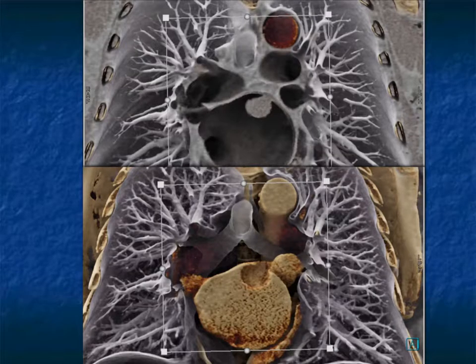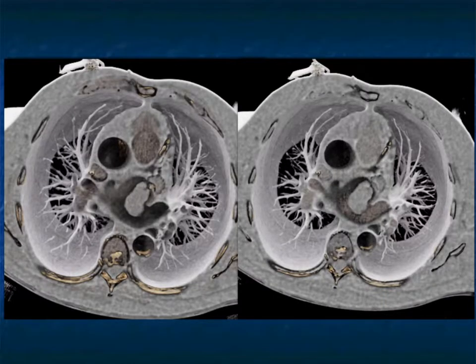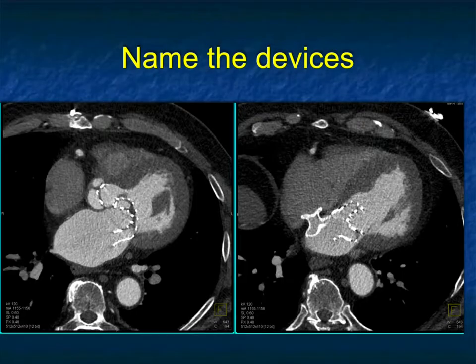I like both of them, but I really love that intraluminal view, and I think there's much more we can do with that that we haven't done to date. Just a really nice example. And there's that thrombus shown from below. And here it is with a more standard view, where the blood is bright, and you see the filling defect, as opposed to the black blood, where the blood becomes transparent, and you use the density of the blood to make it go away. I think we're also going to see lots of work done with devices.